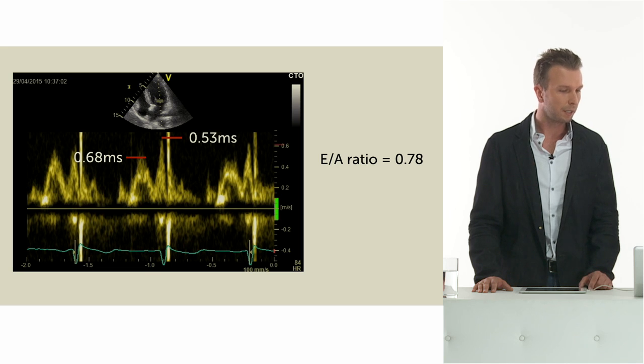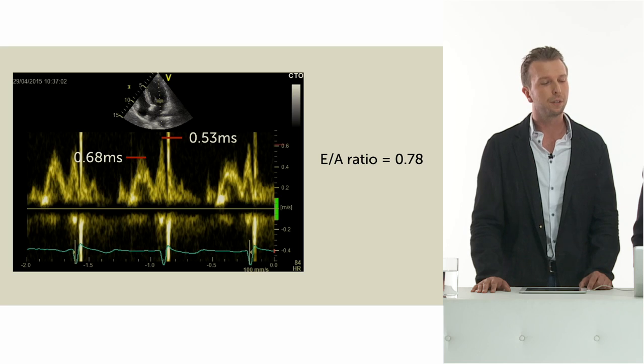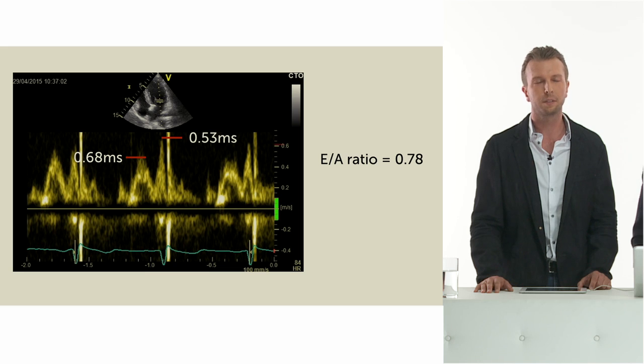And you would not even need this here, right? Yeah, that's the key point. The key point of the guideline is that in patients with normal ejection fraction, you can stop at the point you have measured the 4 parameters and decided whether there's elevated filling pressures or diastolic dysfunction or not, and you don't have to confuse yourself with the inflow pattern. That's a key message for patients with normal ejection fraction. That's important.